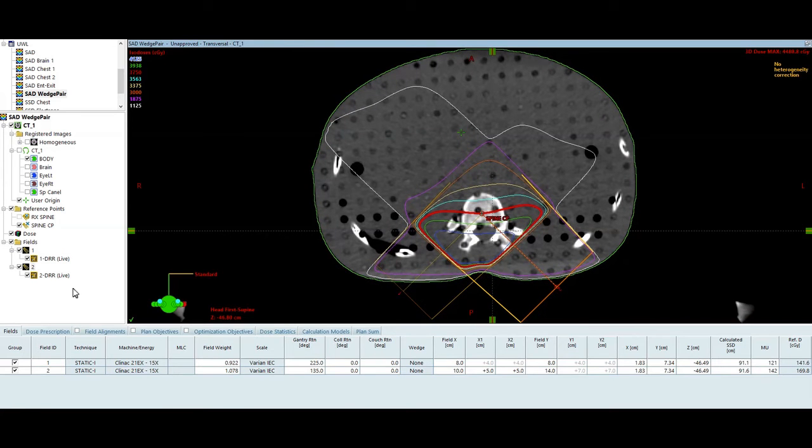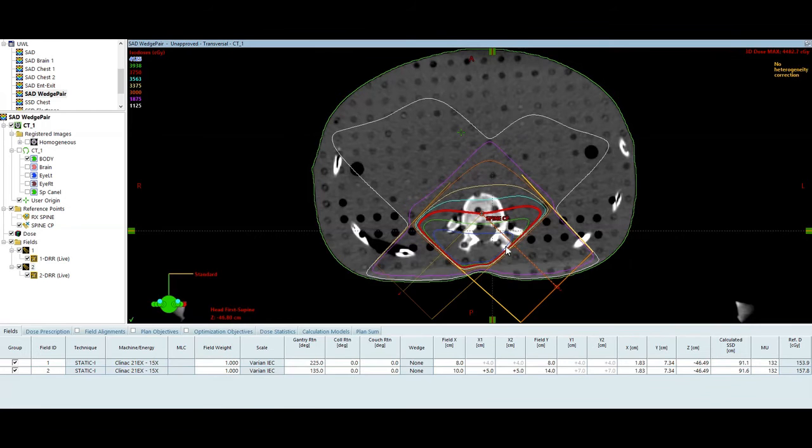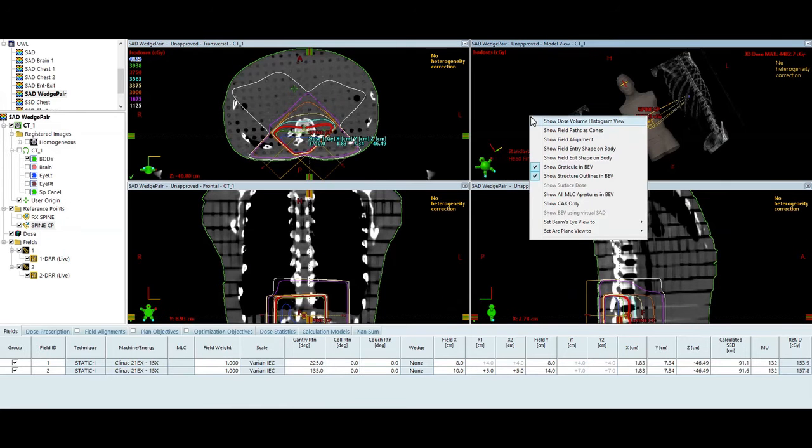Right now I have equally weighted beams. I have 15x. So if you are going on the beam data tables that are available on the website, make sure that you're following along on the proper data table. You're going to want 15 MV TMR. I have this calc point in here, spine calc point. I've named it a calc point, but that's where my isocenter for my fields are as well. I don't have any MLCs.